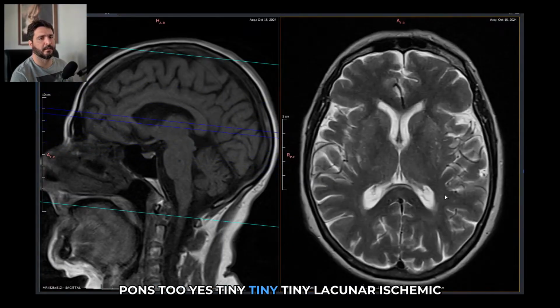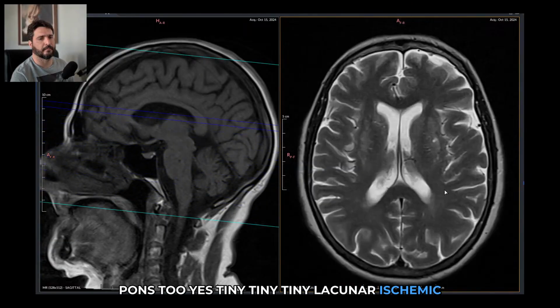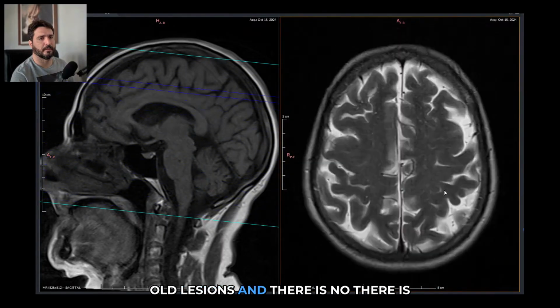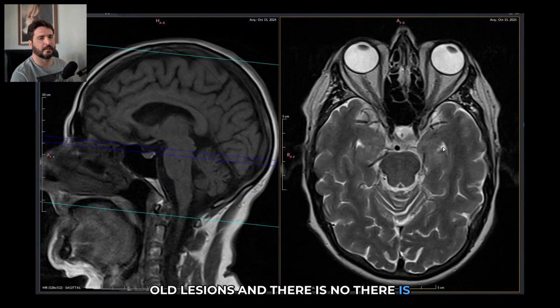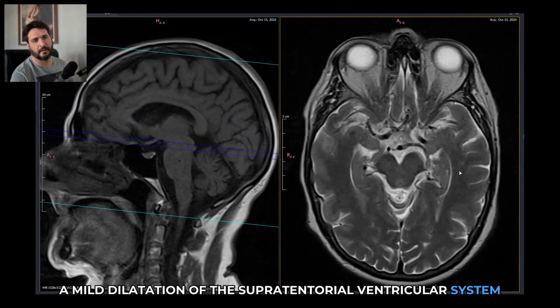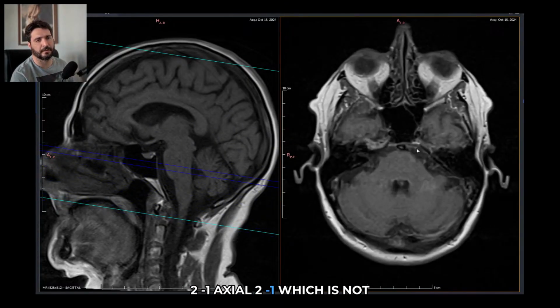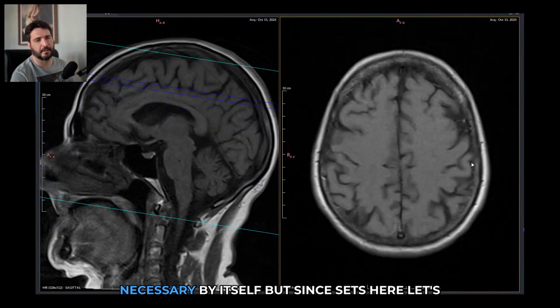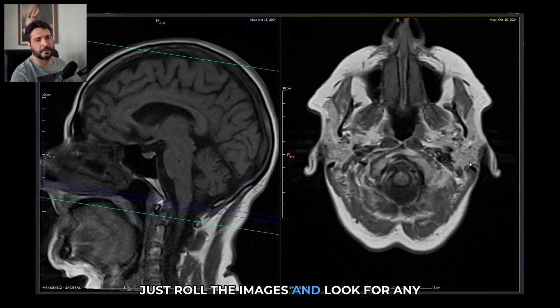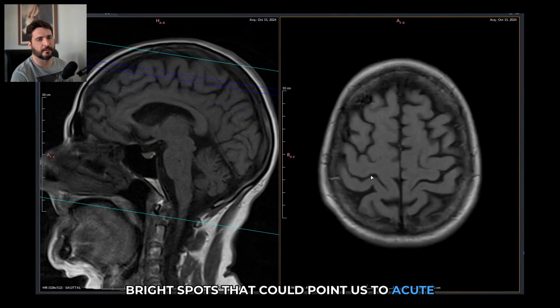Yes. Tiny lacunar ischemic old lesions. And there is a mild dilatation of the supratentorial ventricular system. Nothing major. This is an axial T1, which is not necessary by itself, but since it's here, let's just roll the images and look for any bright spots that could point us to acute bleeding.